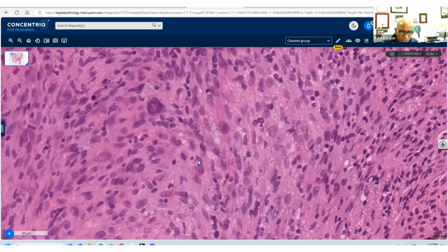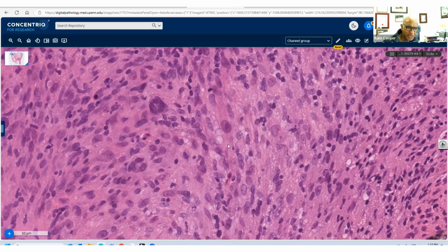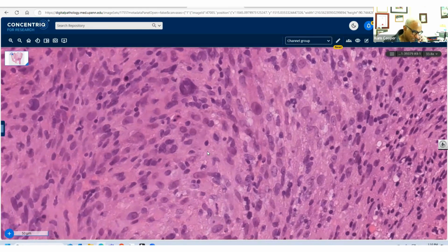The other differential that Maria mentioned was sarcoma. Some form of spindle and pleomorphic sarcoma would certainly come into that realm, now that we've mentioned that S100 and SOX10 are both diffusely positive. And she also, like a true neuropathologist, suggested next-gen sequencing, which neuropathology does routinely for all their tumors. I wish we had that in sarcomas, I really do. But nobody really cares about us. So we're left to morphology, immunohistochemistry, and our good old FISH.